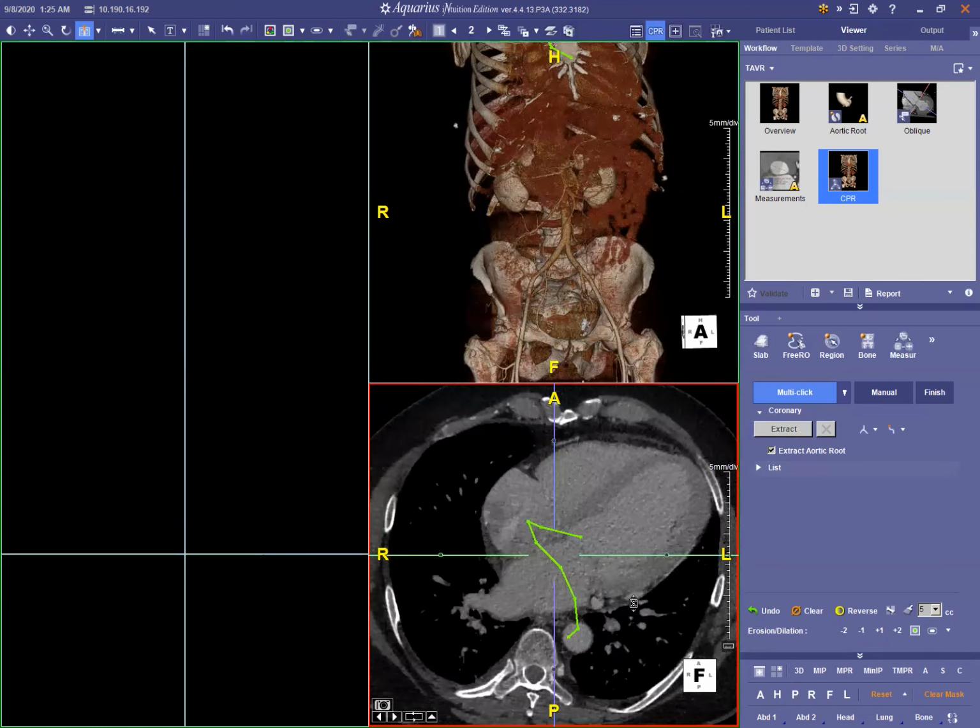I'll just try to redirect everything where it should be. And now I think we're below the, not quite. I'm trying to get into the annular plane, and I think that's reasonable. We'll delete everything to the red dot, which is the more proximal part. And then let's try to view the control points now, see if we're there.